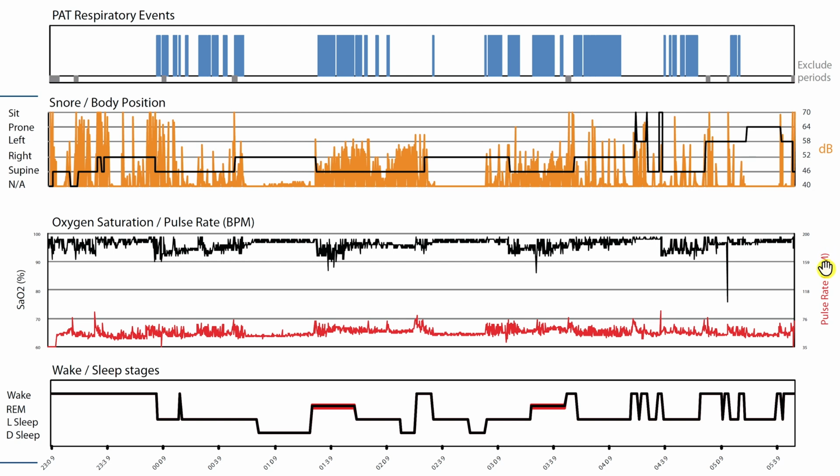So what do I mean by that? If you're looking at pulse rate, imagine none of this black stuff was here, none of this writing was here, none of this over here was there. It's just blank. And then it makes more sense. Remember, these numbers aren't there, just these numbers, because this is the pulse rate side, right? And then you can look at it and it makes a little more sense. So as you can see, again, the same comment as before, it doesn't help a whole lot looking at it from so far out, from 30,000 feet.